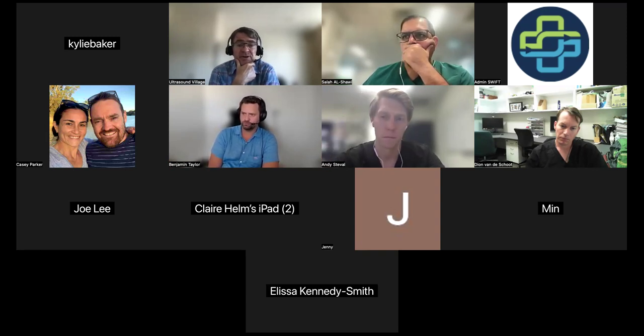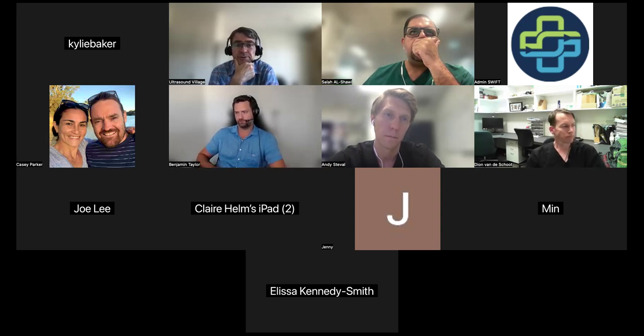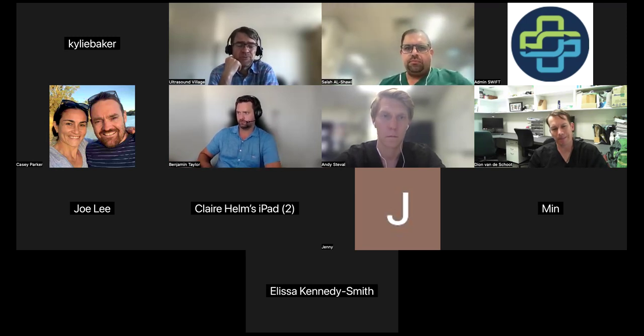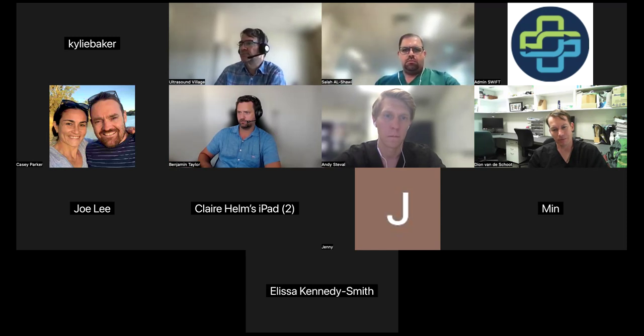Because I get asked not uncommonly, this person had a stent, they've got some back pain, can you tell me if they've got a stent leak? The answer is, if it's really big, but there are actually some ultrasound features that will say yes, there is a stent leak, and you need to be able to either rattle them off or, more likely, type them down very quickly, because it's a not uncommon exam question.